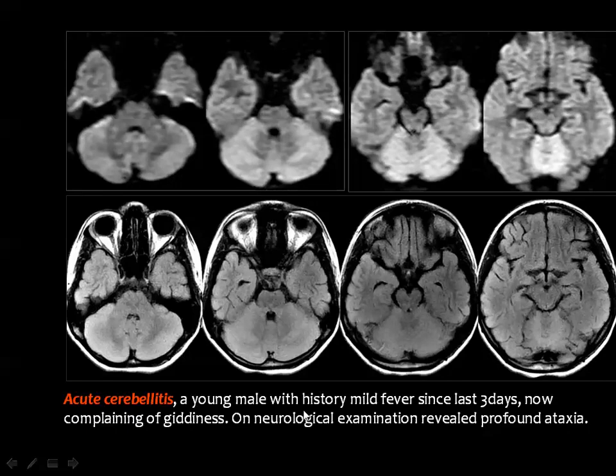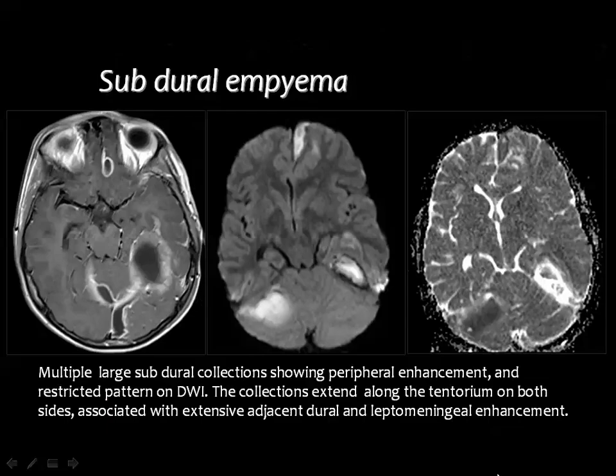A case of acute cerebellitis in the FLAIR images and in the diffusion weighted images, and you got bright signal in the DWI, meaning that there is diffusion restriction.